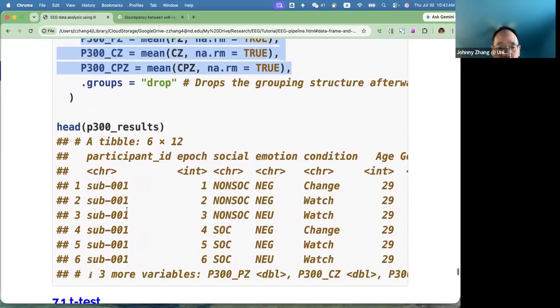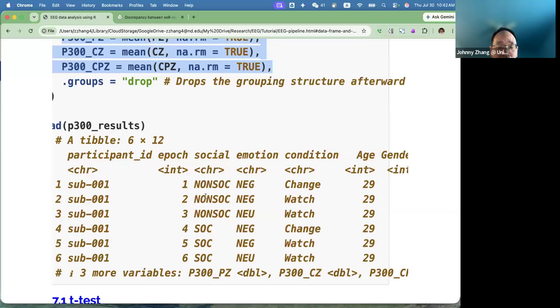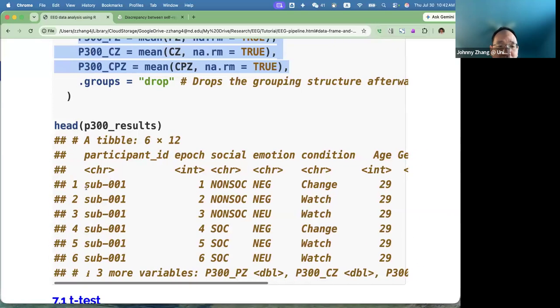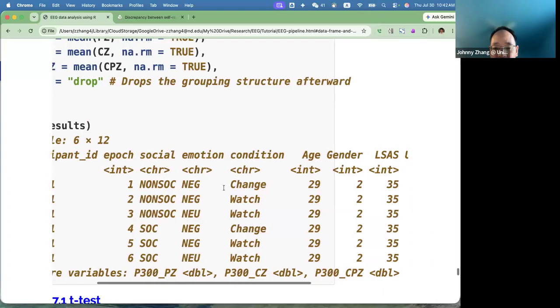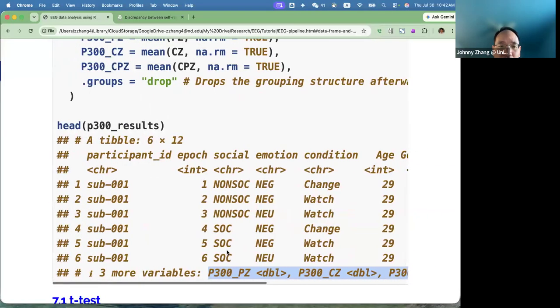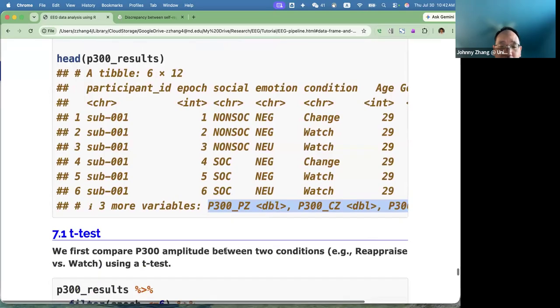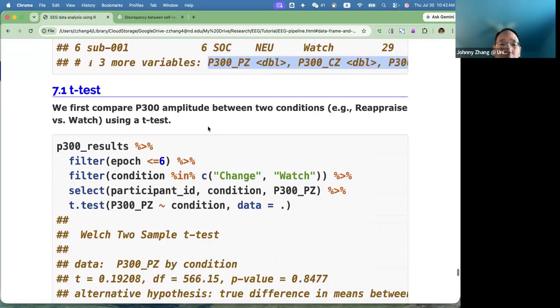And after doing that, you notice that I have data that look like this. So I have a subject, and then it didn't show up here, but I have three columns here. Okay, so there's the average score for the information there. And with that, we can do different types of statistical analysis.